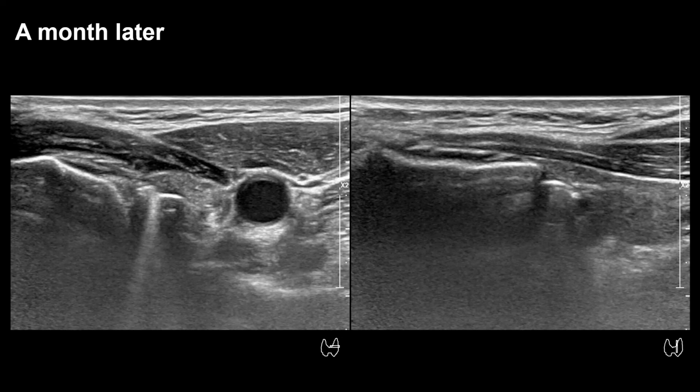The image is the most representative one traced among the numerous image information that the examiner has seen. In ultrasound examination, artifact is also used as an important clue for diagnosis. So we need to carefully perform ultrasound from various angles to know which artifact it is at the time of examination.